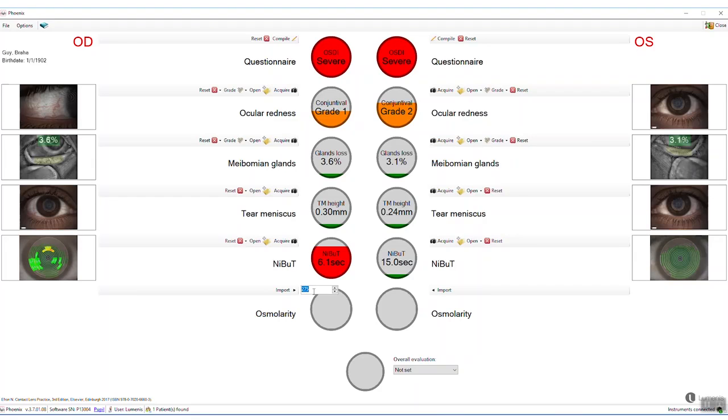And we can basically just click on the enter button, and it will import the osmolarity report that you've got, the amount that you have, and then you'll be able to set this report to how you see fit based on all the information that we have in front of us. What we are doing now is we've completed the report, but why don't we have a look if we're going to use this report as the starting point and not as the end point.